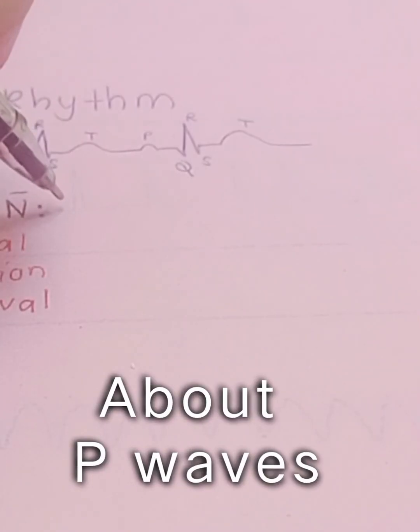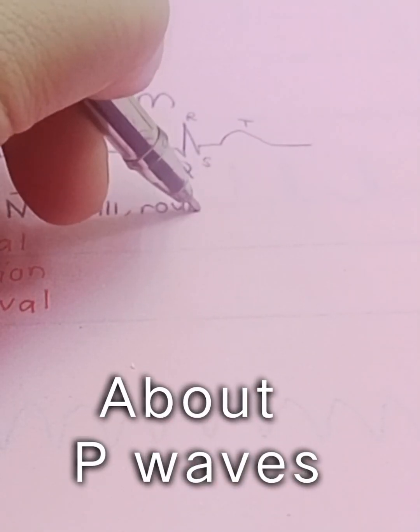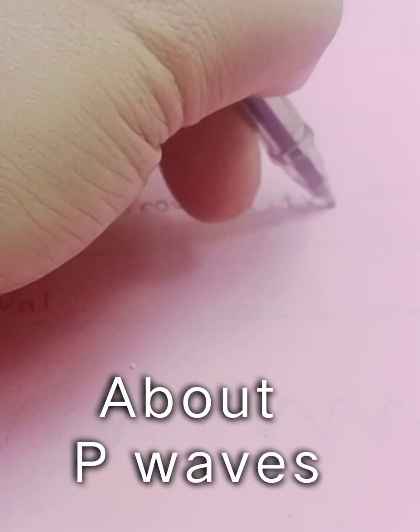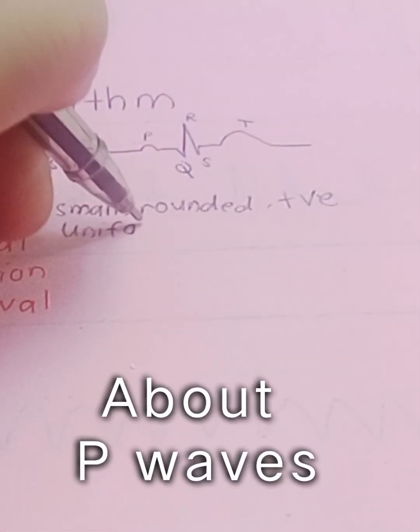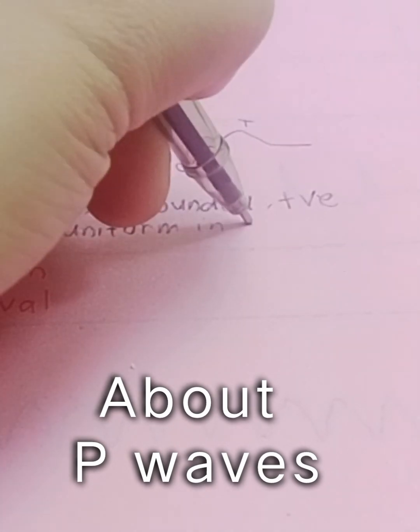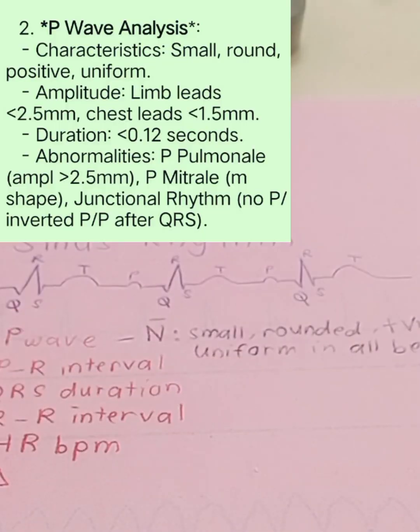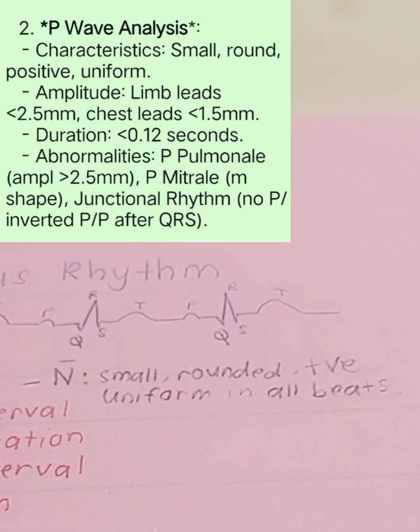P wave, it must be small, rounded, positive, uniform in all beats. What are we looking for in P wave is the small, rounded, positive, uniform in all beats. It comes in the same duration in all beats.